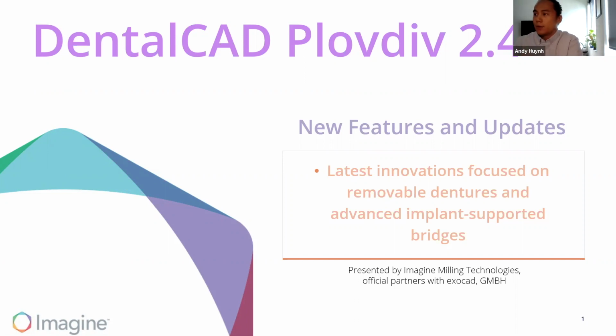So today we're going to be going over exocad's latest release, Plovdiv. We're going to be covering new features and updates, and we are going over 3 recorded demos that we can skip through just to highlight all the new features. If anyone has any questions towards the end after the presentation, we can go over anything in a live demonstration on exocad as well, if there's time available.